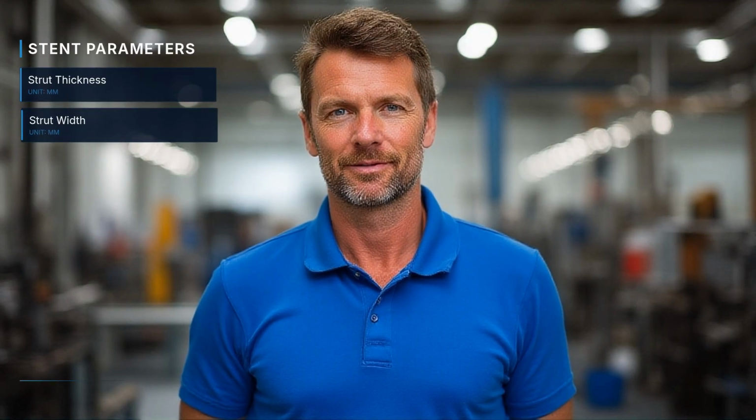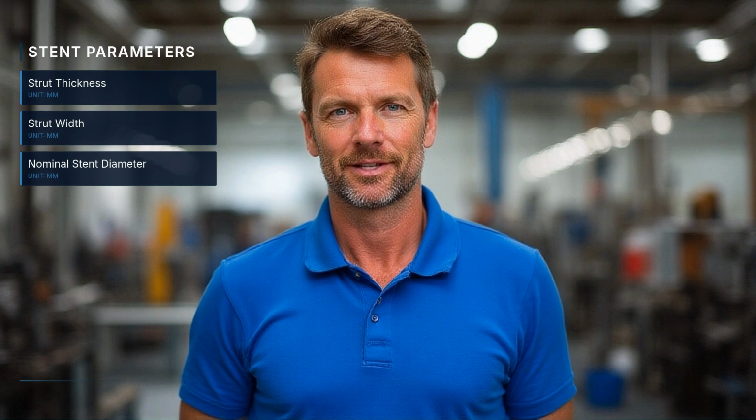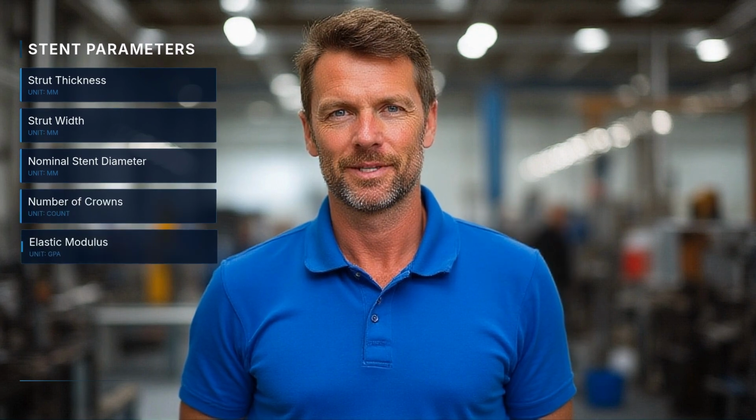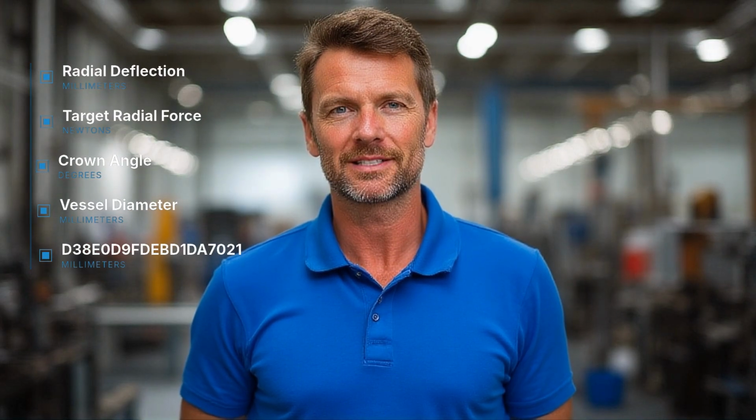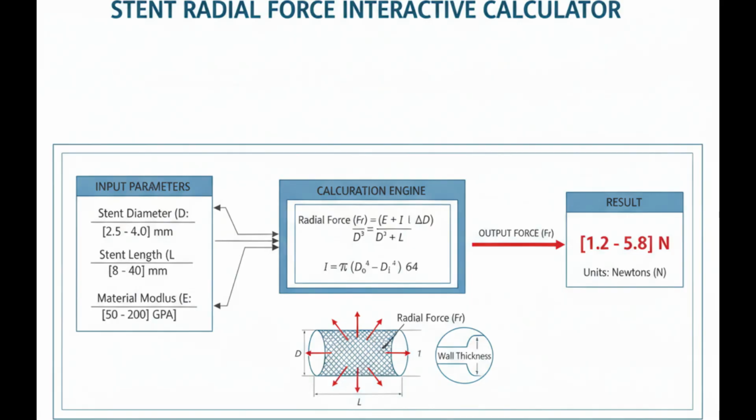The input fields include strut thickness in millimeters, strut width in millimeters, nominal stent diameter in millimeters, number of crowns, elastic modulus in gigapascals, radial deflection in millimeters, target radial force in newtons, crown angle in degrees, vessel diameter in millimeters, and deployment diameter in millimeters. Let me walk through a calculation using these values.